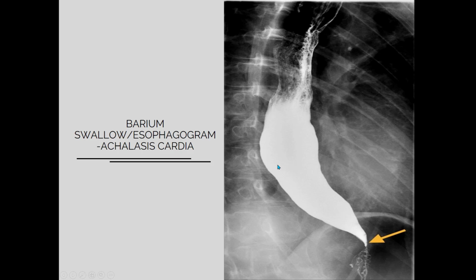Barium studies, these are very frequently asked studies in your exams. Okay, so basically when you see barium in the esophagus, you have to write down that this is a barium swallow or barium esophagogram. Okay, that is for the X-ray that you have to write down.